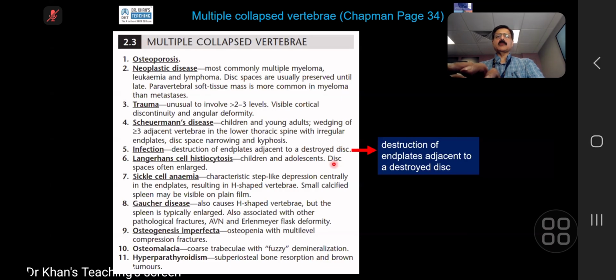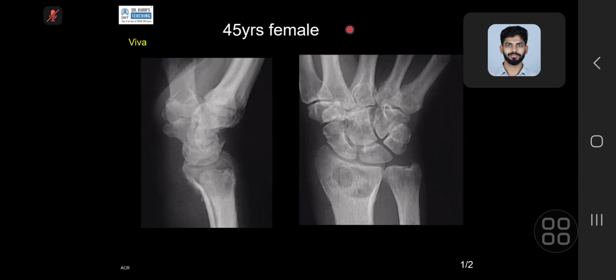Yes, please. Provided frontal and lateral projection of the wrist with proximal hand showing an ill-defined lytic lesion involving the distal radius epiphysis with a wide zone of transition and a thin rim of sclerotic margin.